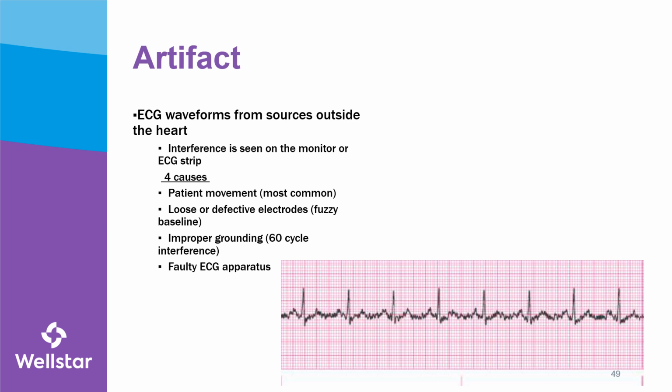Always confirm that this patient is not, in this case, in AFib. I don't think they are. This definitely looks like a sinus rhythm with artifact. I do see P waves kind of there. I do see some T waves. There's a QRS. It's just really noisy, per se.